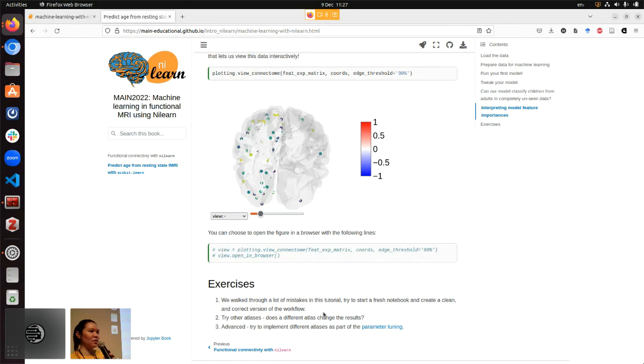For example, in the beginning we trained the model with all the data without cross-validation. We want to exclude that part if you want a piece of code that is actually working for your research. It is very common for people to develop their pipeline in a Jupyter notebook. So the skill to port that from a notebook into a script that can be cleanly executed is a very important skill. Although this is not directly related to machine learning, as a general research skill it is going to be very important.